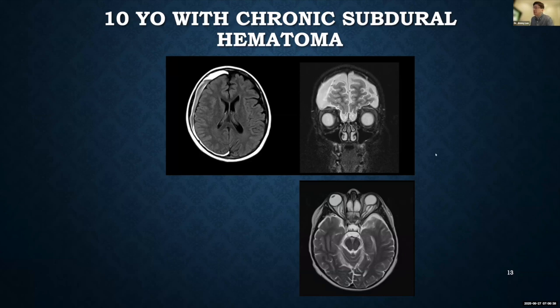And interesting here, you have a subdural convexity hematoma of various different signal. And there's actually thinning of the calvarium on this side relative to the other side. So there's remodeling. Here's the right convexity subdural collection with mass effect on the cerebral sulci. You can see the olfactory groove. Look how big they are. So there's a remodeling of the olfactory groove.